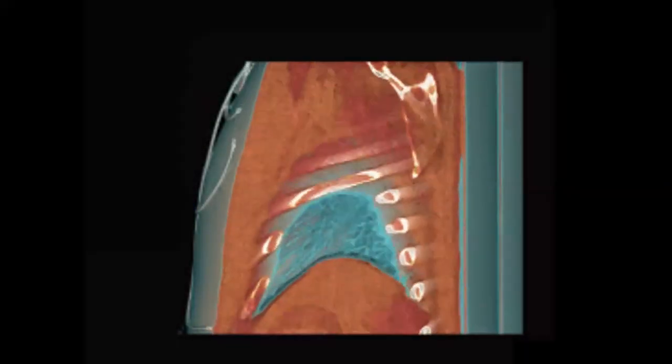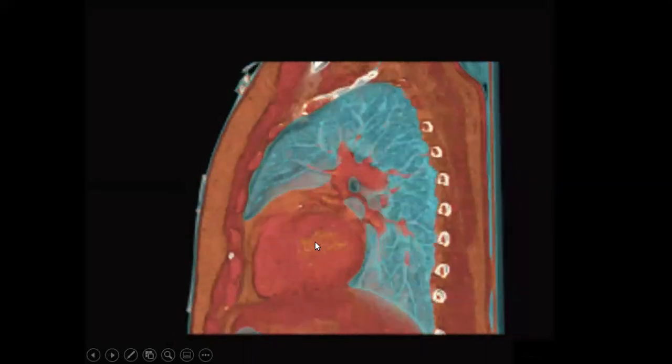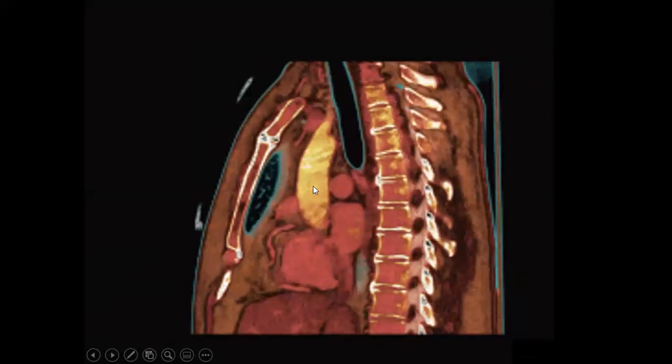Well, let's peel away to the lateral. And as we peel away to the lateral in this patient, this is the same CT scan in the same patient. Here's the heart beating. Here's the ascending aorta. And now right behind the ascending aorta, this is the right pulmonary artery.